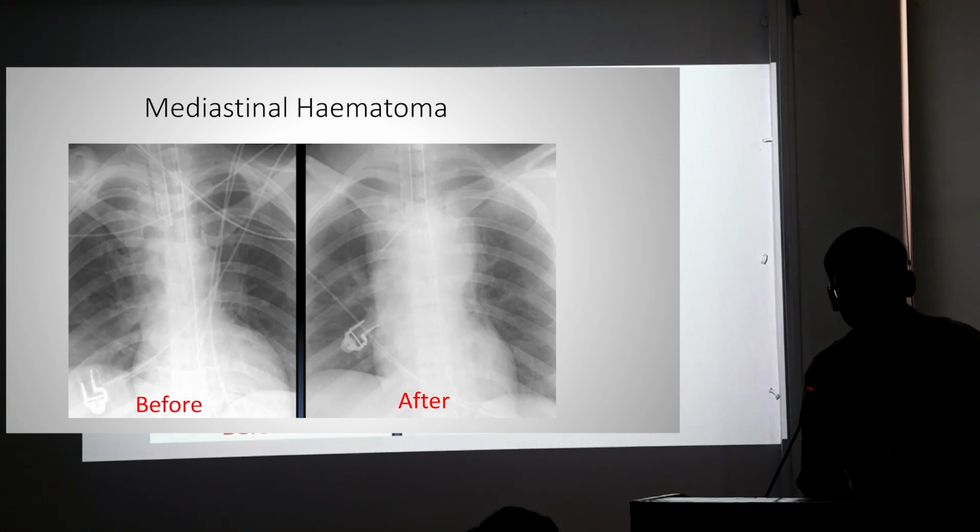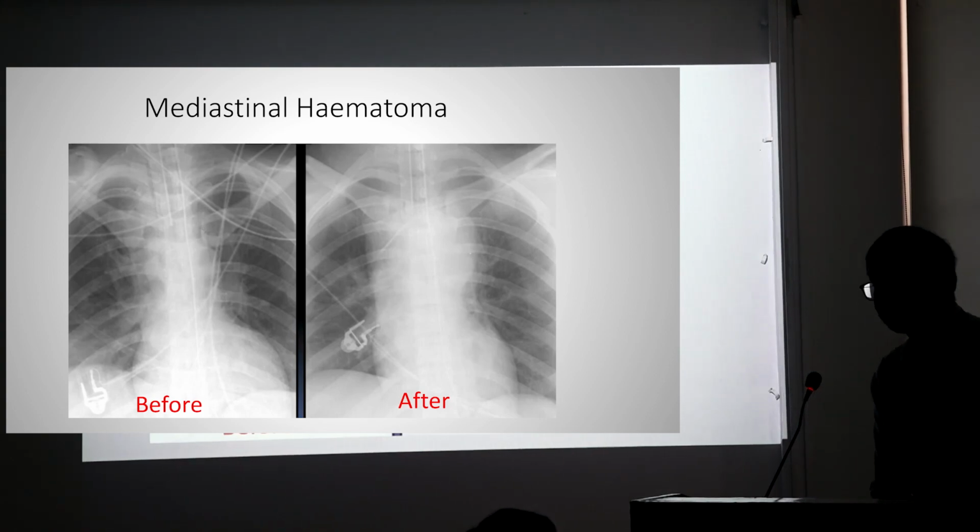Anything obvious? Yeah, somebody said there's a mediastinal widening. So the patient had a mediastinal hematoma.